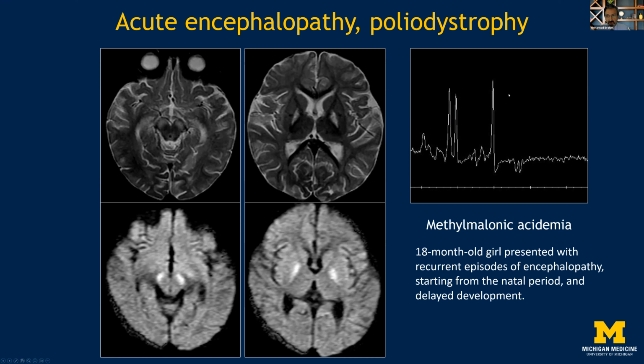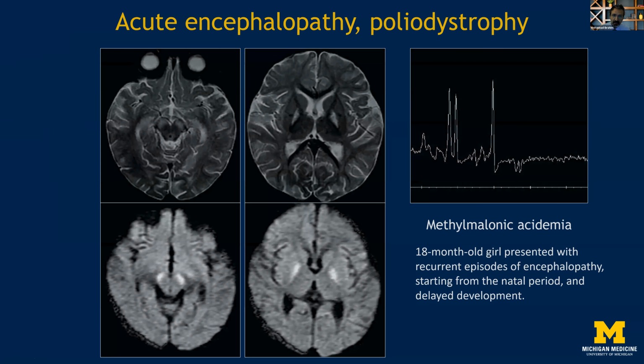On the MR spectroscopy, you can see there's evidence of a relatively low NAA peak. Based on the Hunter's angle, the peak should be somewhere around here, and we can normally draw the line at the 45 degrees angle. This is a relatively low NAA peak, and then there is a doublet at 1.2. This is reflecting accumulation of lactate in the brain. This is abnormal at this age group. Early on, in the first few days, you can sometimes normally see lactate in the brain.